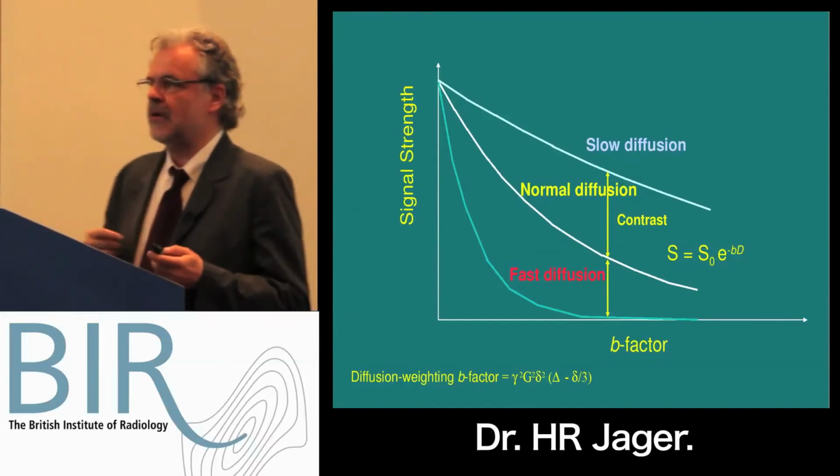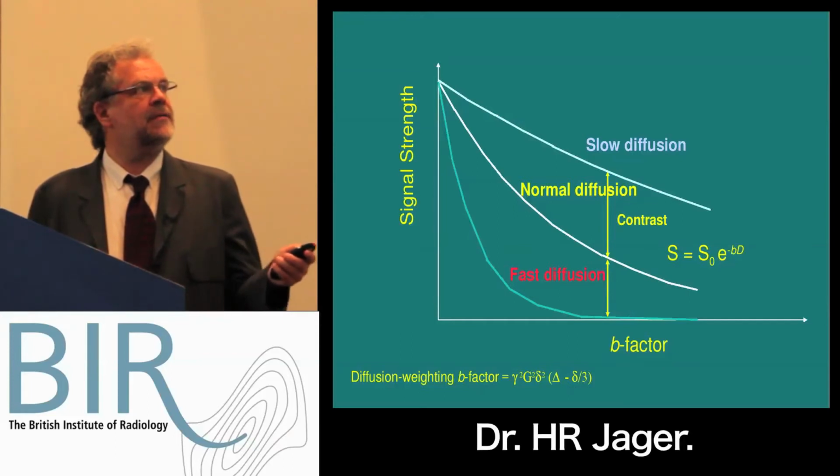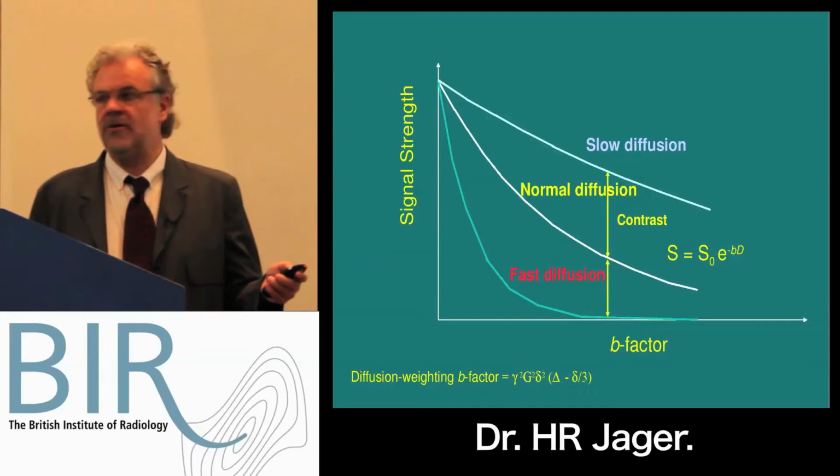So here's an example. It's a frontal glioma. That's how it would look on a T2-weighted image, which is B0. And then as you apply a gradient that increases, you lose signal, first in the CSF, but then also gradually in the tumor.